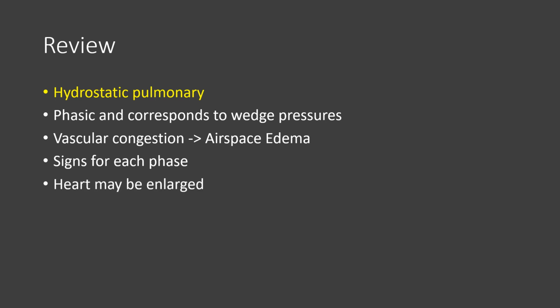Now, it's also important to remember that the heart may be enlarged, and that makes sense, people that have dilated cardiomyopathies, but not all the time. Not all the time is the heart going to be enlarged. If they're in acute renal failure or they're getting aggressively fluid resuscitated, the heart may not be big. In addition, if they have an acute myocardial infarction, the heart may not be enlarged yet. So the heart does not have to be enlarged. And again, don't forget that pleural effusions are very common in this scenario. The body's clearing the fluid. It can put it into the pleural space. They could also be third spacing, accounting for the pleural effusions. So you can see pleural effusions even as the pulmonary edema is actually getting better.